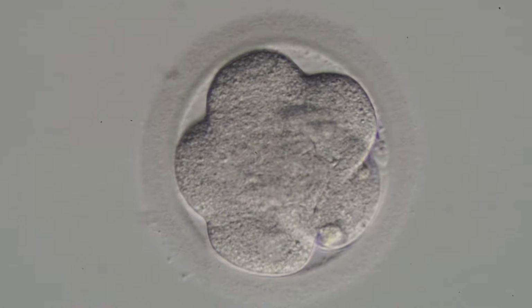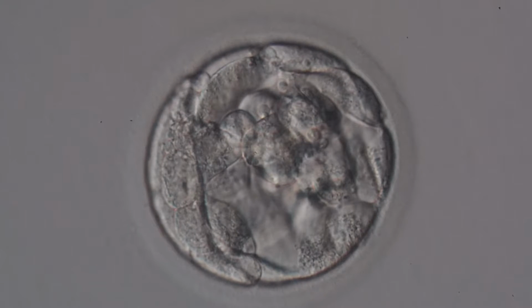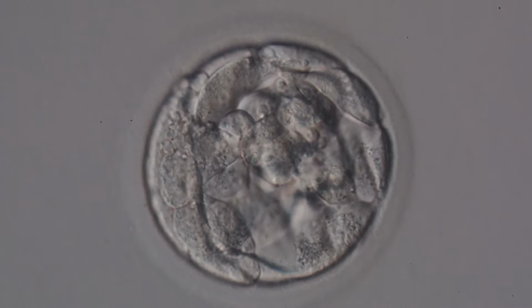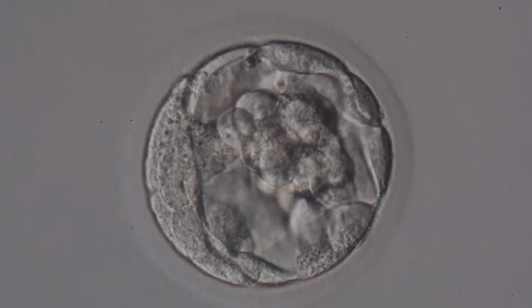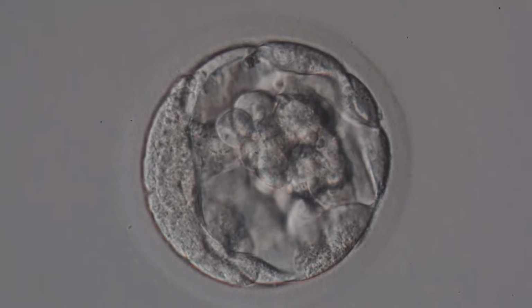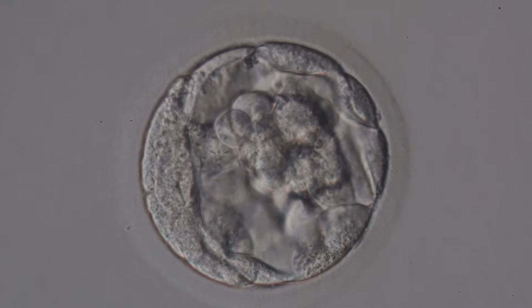Some embryos will have arrested at earlier stages and will not make blastocysts. Others can be at the morula stage, which is the stage immediately before the blastocyst stage. For those embryos that have become blastocysts, we further categorize them according to how many cells they have and how expanded they have become. An early blastocyst will have a small cavity and very few inner and outer cells.